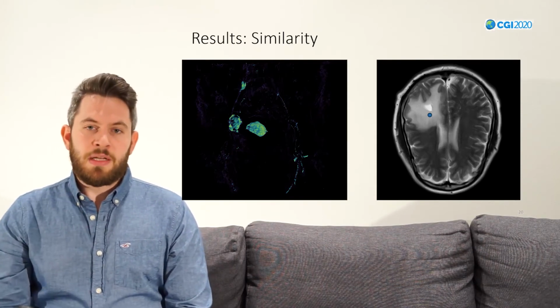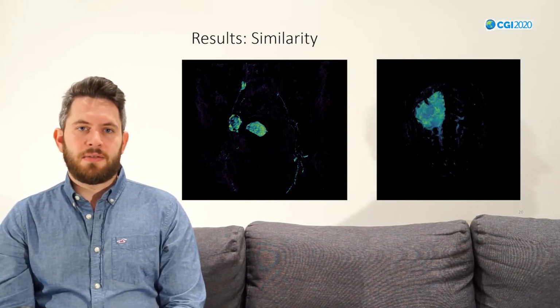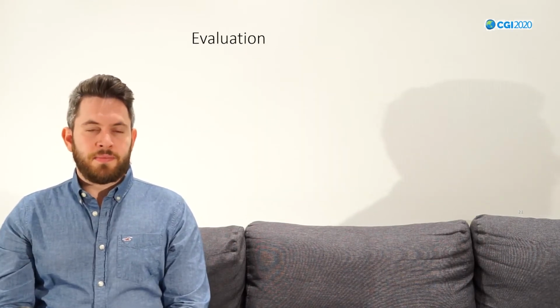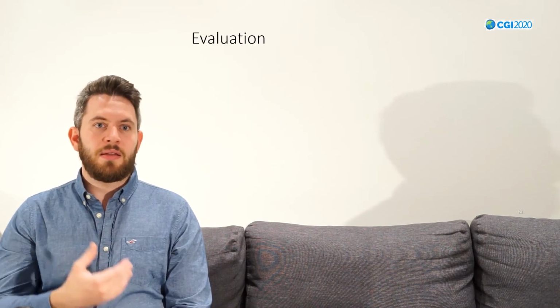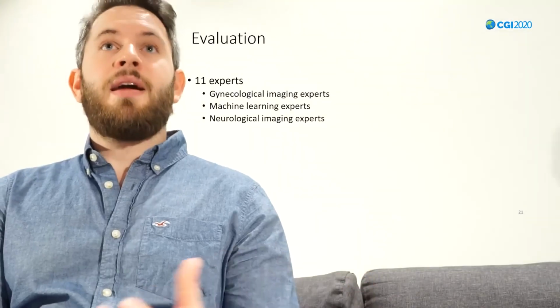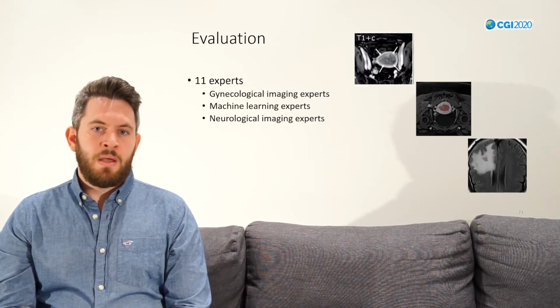But with our multiparametric segmentation, we can see that only the inflammatory region is highlighted. During our project, we were working closely together with 3 experts, one of each field, but in the end we were really lucky that we had 11 experts evaluating our tool together with us.